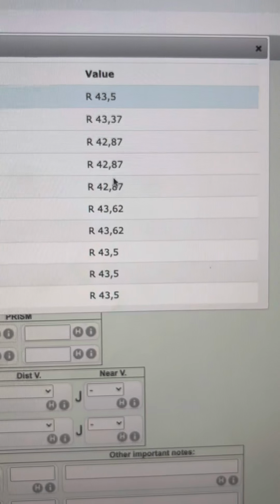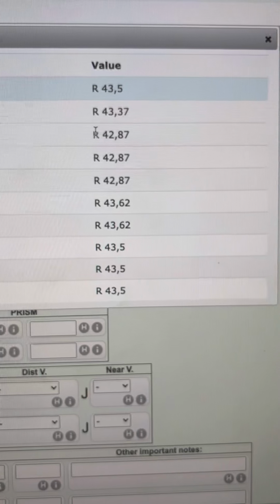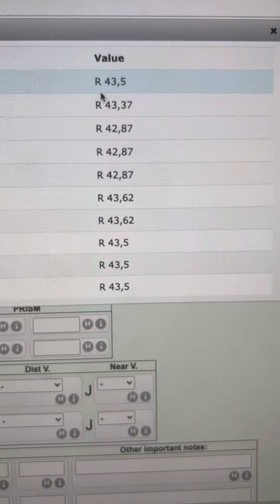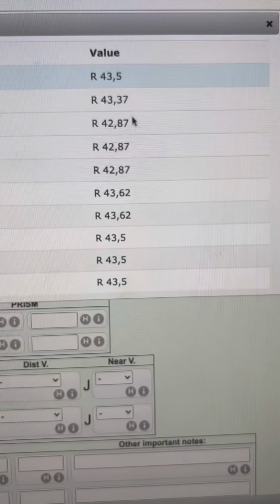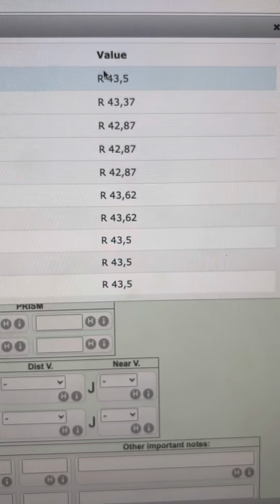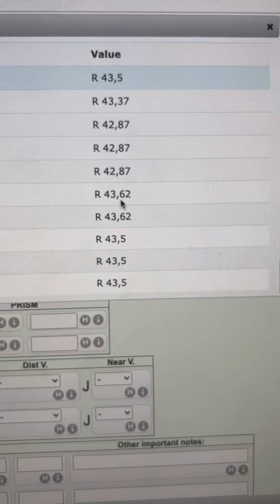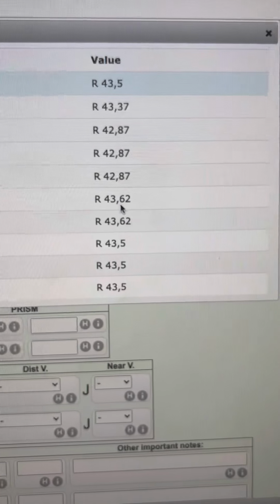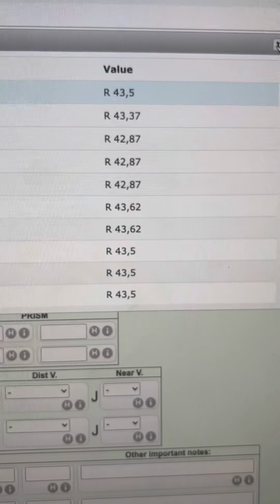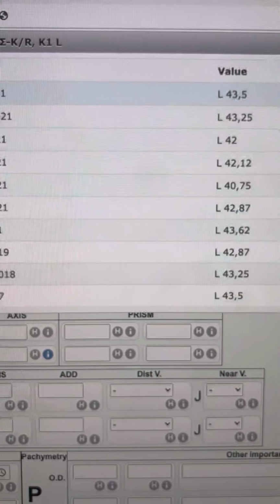And as time goes by, this is 2 weeks after, this is 3 weeks after, and this is 5 weeks after. You can see how keratometry jumped back to the preoperative 43.5, and thus the automatic spontaneous correction of the transient hyperopia that this patient went through the first post-op month. So the take-home message here is we wait. We'll see similar numbers in the left eye.